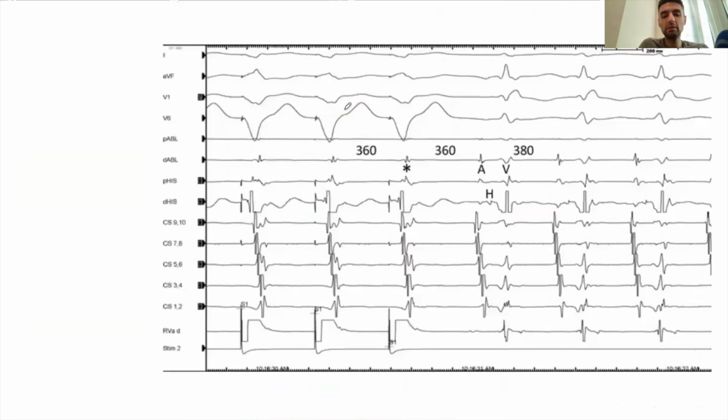Another example here is that your V pacing, again, wide QRS. Okay. Your V pacing at 360, your A to A interval was at 360, your tachycardia cycle length was around 380. So VA, and then you see this A came in at 360, at the exact pacing stimuli interval. So this V actually caused this A. So this is an example of not a VAAV response, rather it's a VAV response. So you have to be careful.